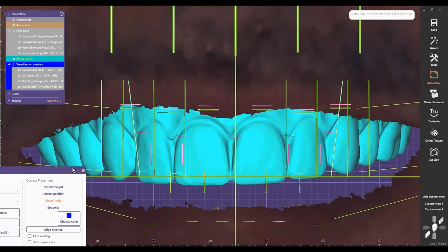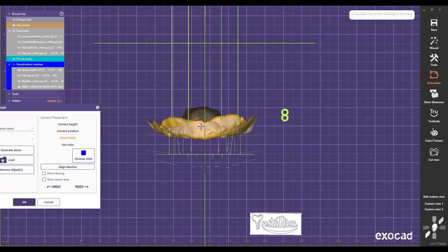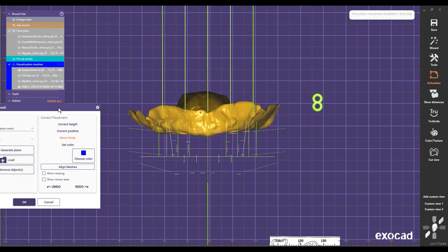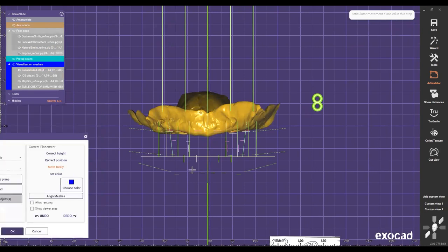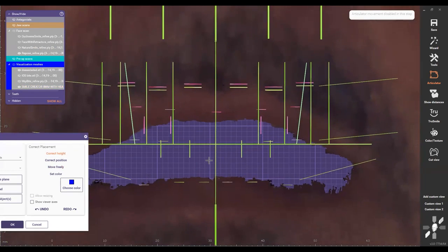So the only thing I need to do here is find a new incisal edge position for my patient, right? And the only way I can find it is by using repose. Aesthetically, the study says that if we show at least 2 millimeters of incisal, we're going to get nice aesthetics, a beautiful smile, because the patient is going to show enough teeth in repose and also in the natural smile. So I'm going to go ahead and measure 2 millimeters from this spot right here.